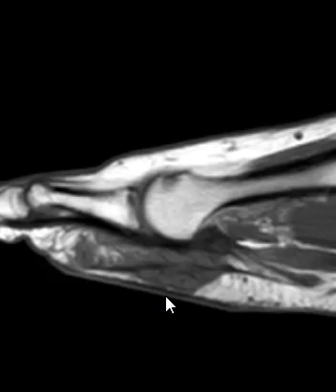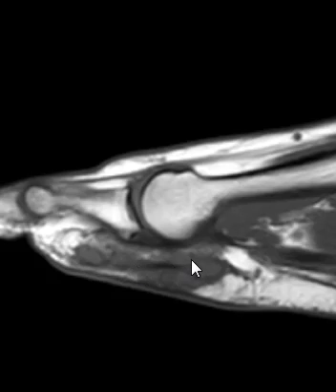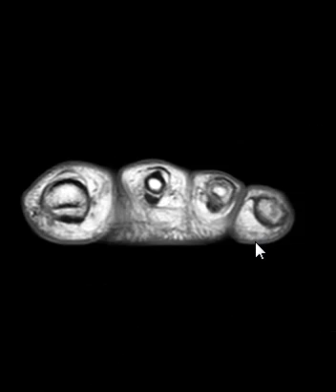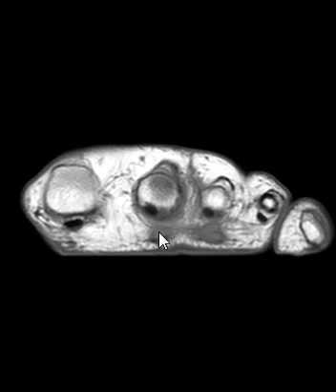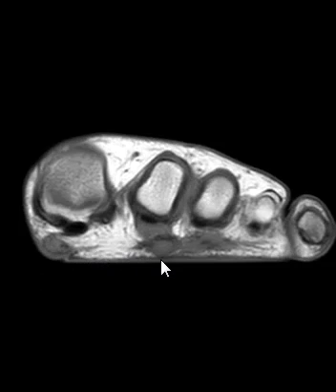Again, it's more infiltrative, it's not in the classic location. You can see here on the T1 image, it's ill-defined and some mass effects. Sometimes it can even erode bone. On the short axis T1 image, we can see the process probably even better. Here we go, beneath the second and third metatarsal heads. Also down here beneath the first metatarsal head.